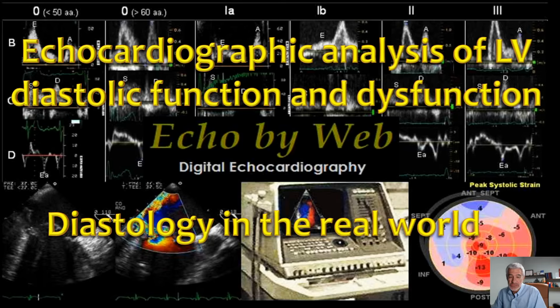Now, these talks assume that you have a basic understanding of how to perform pulse Doppler and continuous wave Doppler interrogation of intracardiac flow, and also how to use tissue Doppler, myocardial tissue Doppler. And it is also assumed that you know how to perform basic echocardiographic measurements.